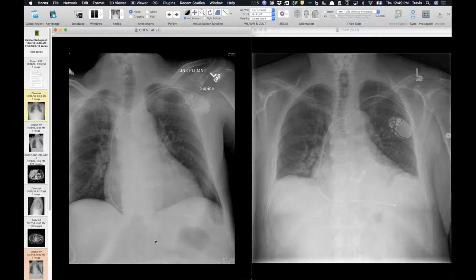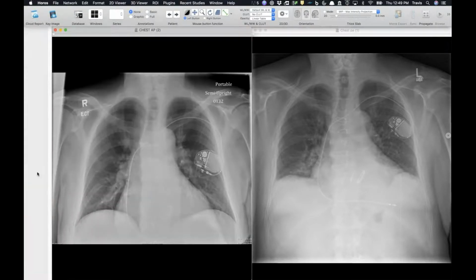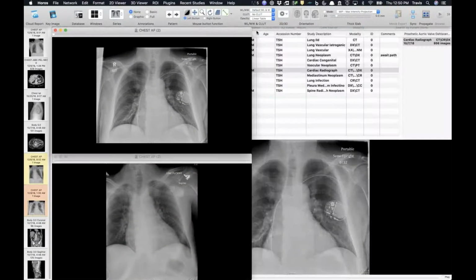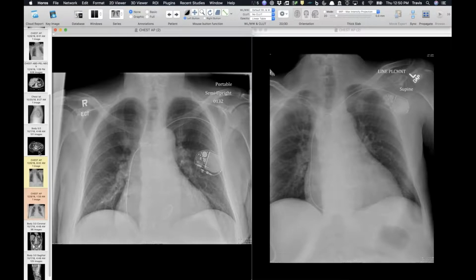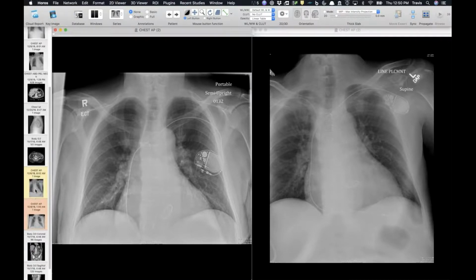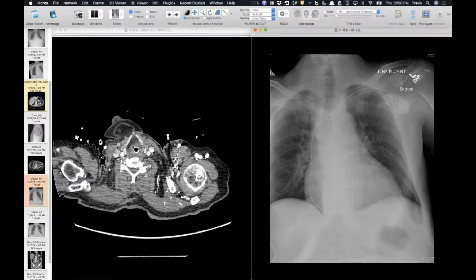Howard, you were going to comment? Oh yeah, the orientation of one of those devices is changed, or both. Yeah, well, I think this is the only valve. I think these are just vertical median sternotomy wires. Oh, okay. Yes. And what's also interesting is this radiograph on the 8th. He had a series of 2 radiographs taken a couple hours apart. These 2 were both at the outside. And you can see the orientation is even changing over the course of hours. And it's not surprising, of course, the change in orientation is an indicator that the valve has dehisced. And this patient in the past had gallstone pancreatitis last year, has had several recurrent infections, and now comes in septic and hypotensive.